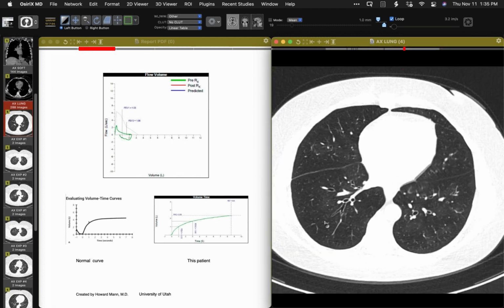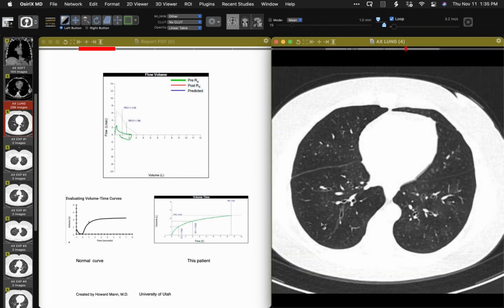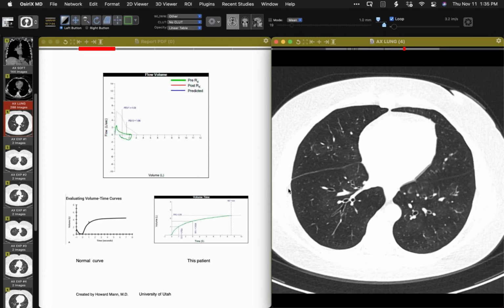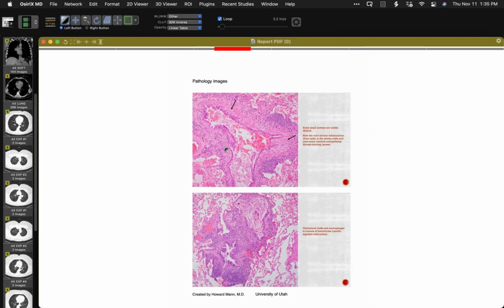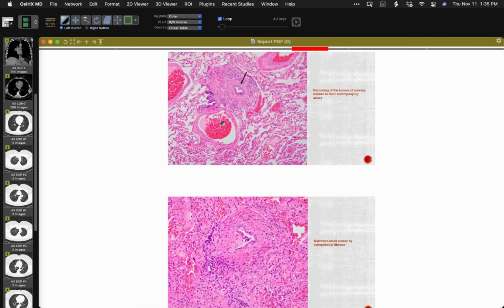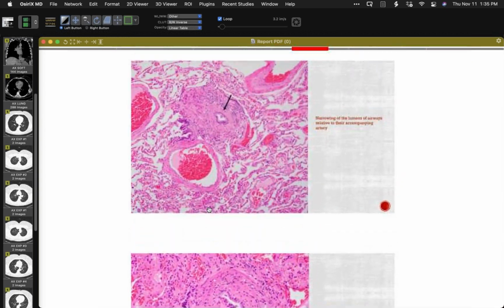Exactly. So there are a number of subtle observations, but one has to interpret this in context as well. In a patient with severe obstructive airways disease, this is constrictive bronchiolitis of substantial severity. And then just to complete the case, here are annotated images from the open lung biopsy. In the interest of time, I'll go to the images that show the pathology best.